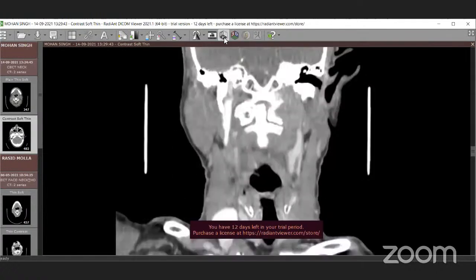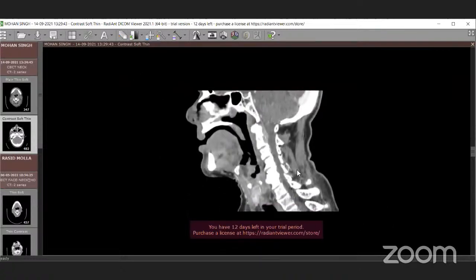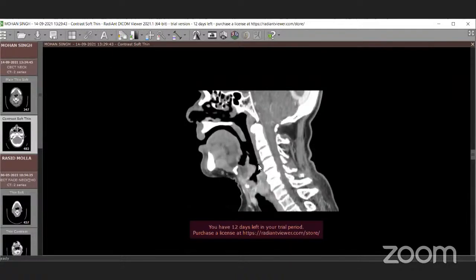First, let's define the oropharyngeal cavity and how we actually demarcate which part of the cavity is what. This is not a straightforward anatomical case, but a pathological case. So first, we draw a few lines on the sagittal along the inferior margins of the vertebrae.